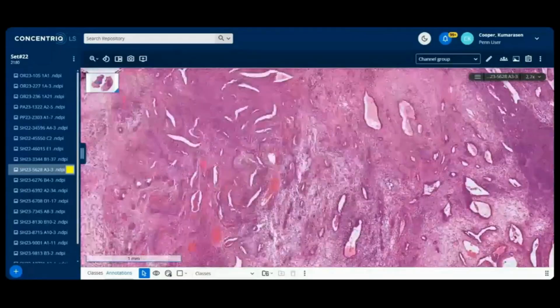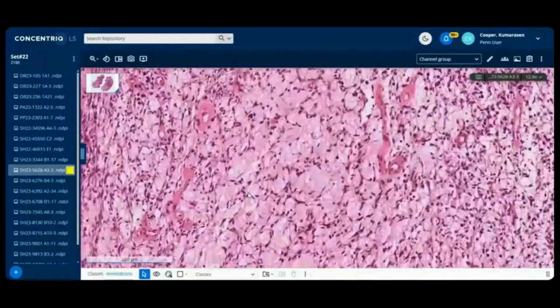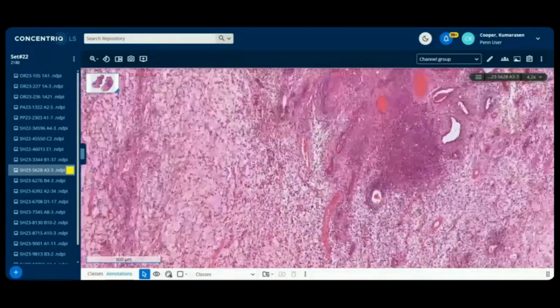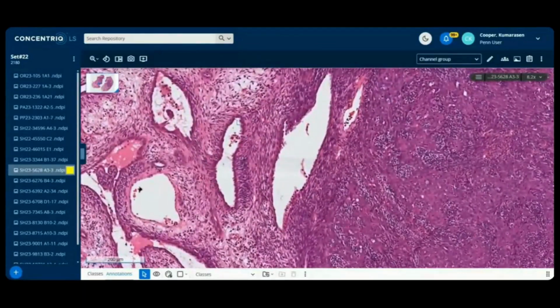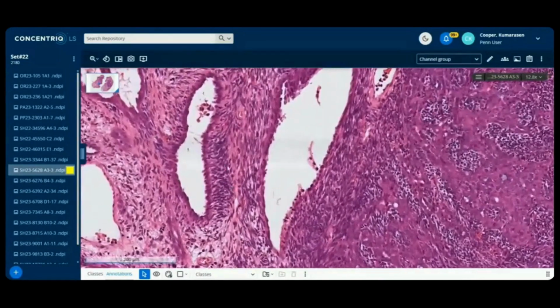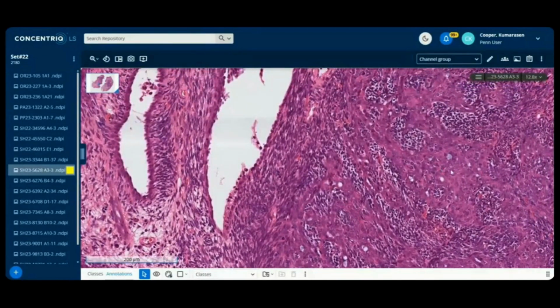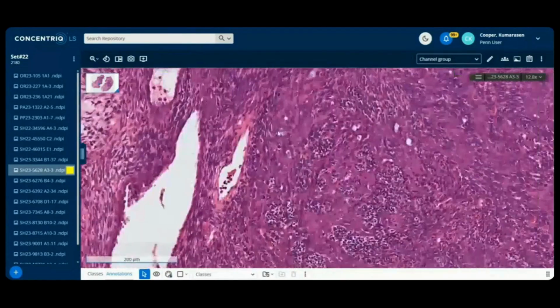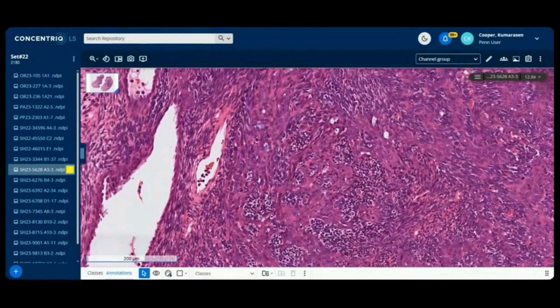And just to remind you about this area, which is the same tumor cells, I believe, but in a much more edematous background. I'm deliberately showing you this area. We can come back and talk about this area. But for diagnostic purposes, you could focus on these gland-like structures here, along with the spindled stroma, because I believe these are also those epithelioid areas, and they are just forming these gland-like structures. They're the same component of that. Okay, so we are good to go.